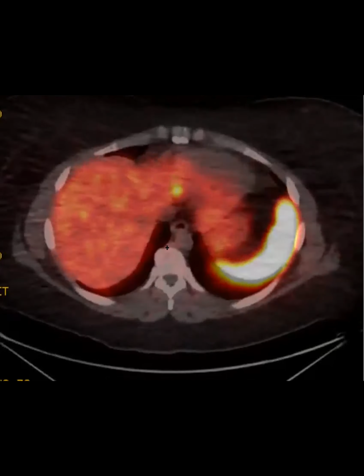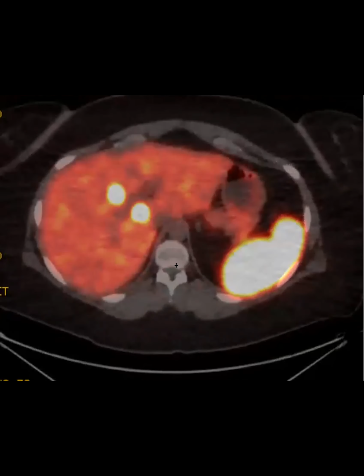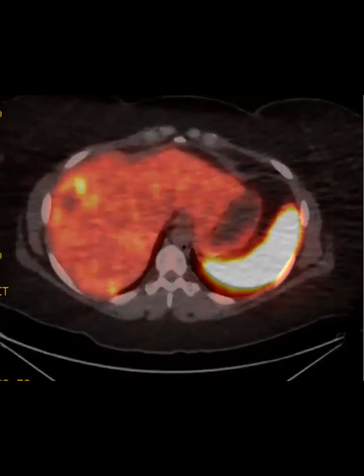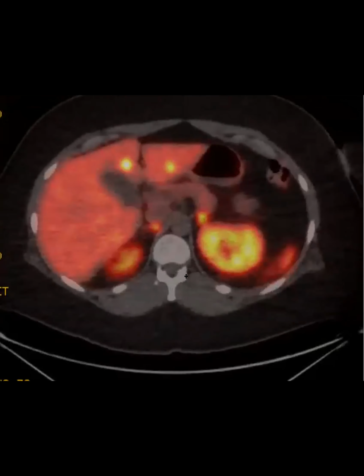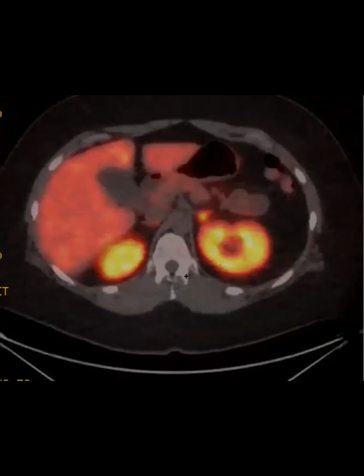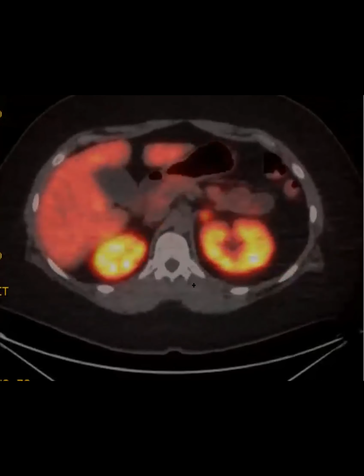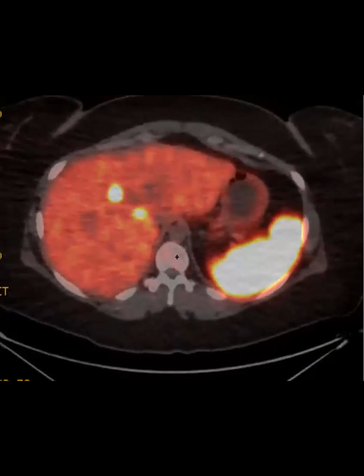This patient is a young female with a history of paragangliomas, carotid bodies. So I just wanted to show mostly the fellows. Paraganglioma mets then? I mean, this is a recent case. I think that's probably what is going on here. But I just wanted to show, like I said, mostly the trainees.